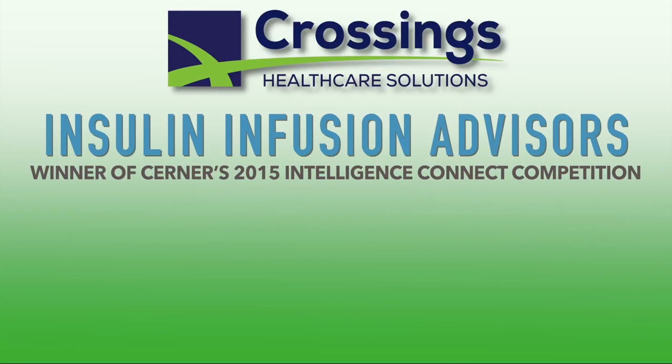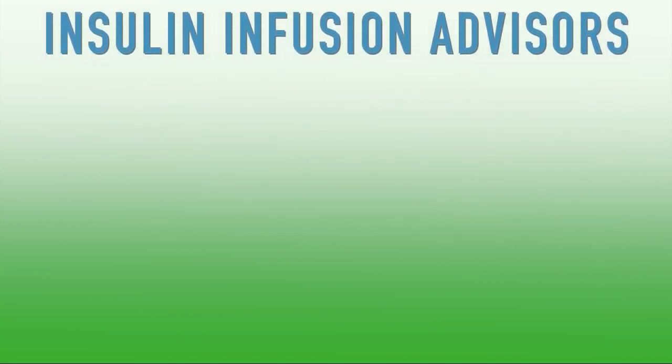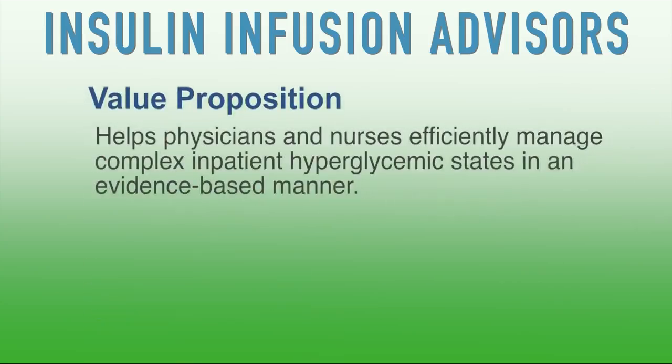All of the solutions we will demonstrate today are in production domains at multiple facilities and have led to improved outcomes, primarily reduced hypoglycemic episodes. Our insulin advisors help physicians and nurses effectively manage complex inpatient hyperglycemic states in an evidence-based manner.